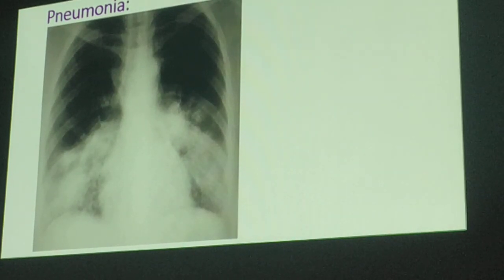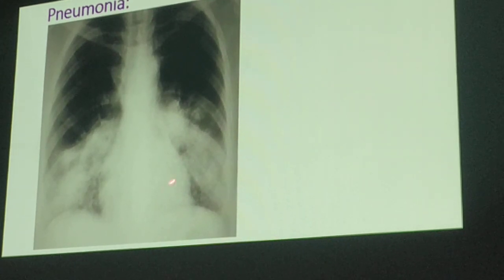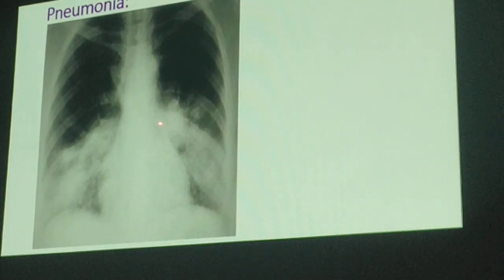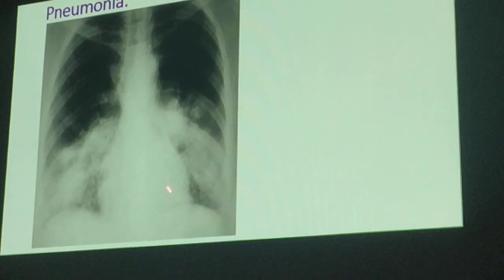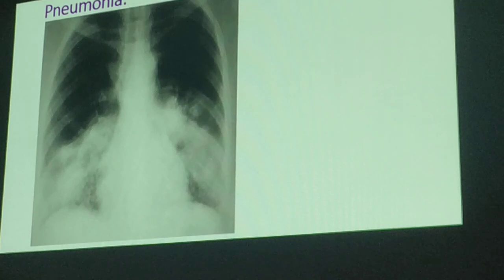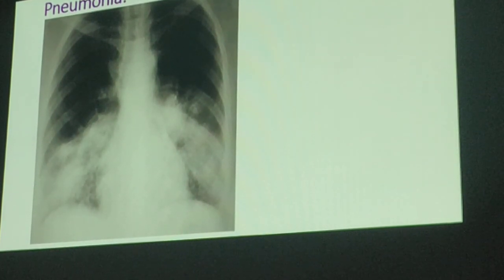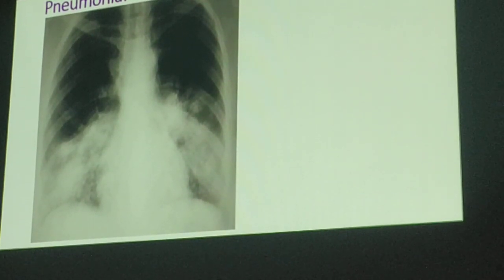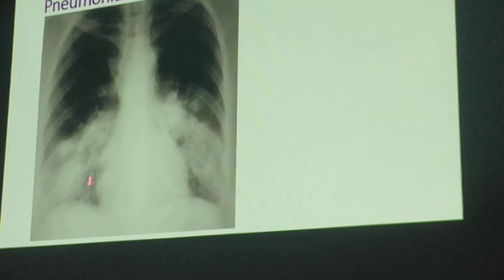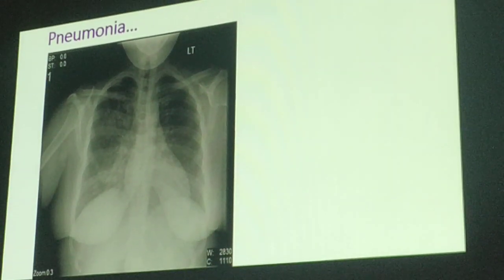But in here, the cardiac silhouette is still clear, unlike the first film. To see still the border of your left cardiac border and then your right cardiac border, you could still follow, okay? So, hindi mo pwedeng i-describe na right cardiac border, left cardiac border is obscured, okay? It's still intact, okay?